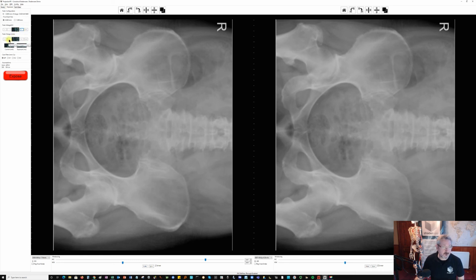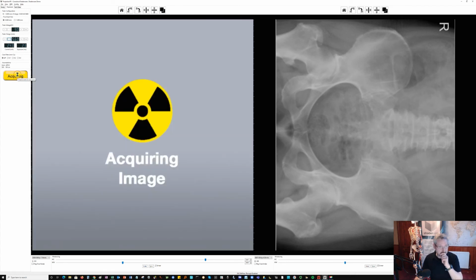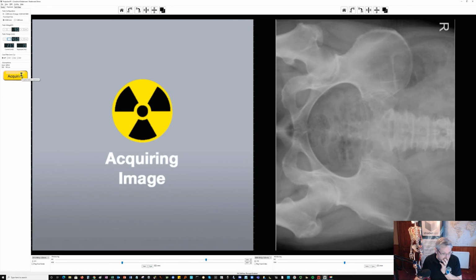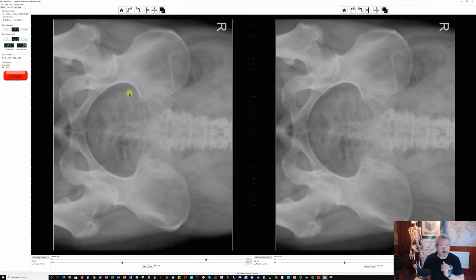And then finally, our fourth exposure, 90 kV. We need to drop this by about 50%, so we'll drop it by about 2. 370, drop it a little bit more. 331, try one more. 298, perfect.